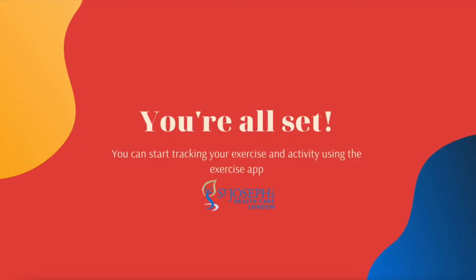You can now track your activity and exercise using the exercise app. If you have any questions or concerns, please contact your rehab trainer.